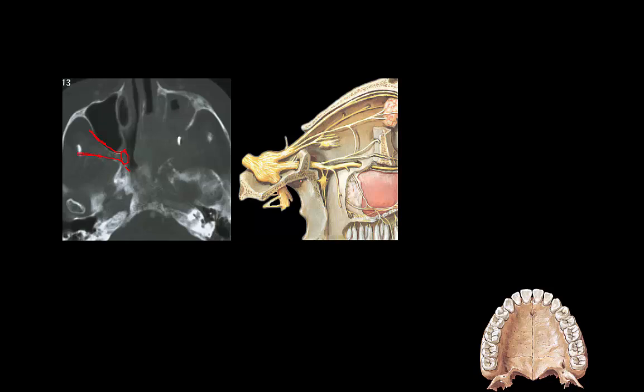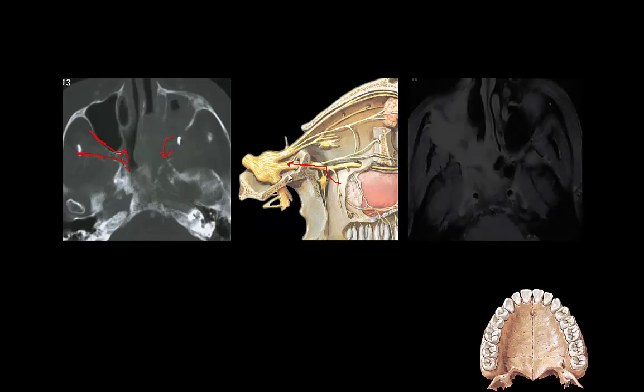So the V2 runs in the roof of the pterygopalatine fossa. So anytime that we have tumors that are extending back here in the pterygopalatine fossa, they can jump along V2 and grow posteriorly. Now, typically, the referring physician knows that you're already dealing with a malignancy. Why? Because the patients typically present with numbness. They can look in and see a mass, and if the patient's numb, they know something's bad. But what they don't know is what is the proximal extent of the tumor.